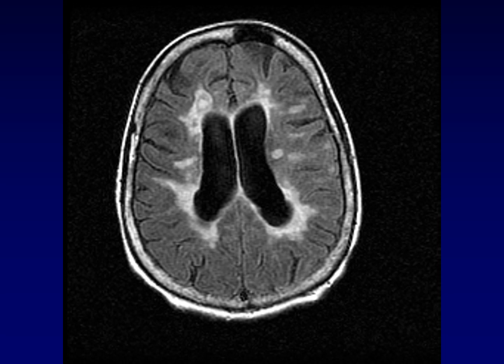This is the same patient, and you can see on this FLAIR image, which is a type of T2-weighted image, you can see abnormal white matter all the way around the ventricles. In fact, these are oval plaques of abnormal white matter that have become confluent and flowed together, and you can see finger-like projections of abnormal white matter extending out to the periphery of the brain. This is a classic example of an inflammatory disease of the white matter called multiple sclerosis.